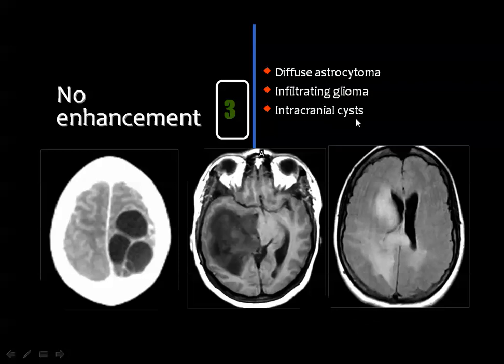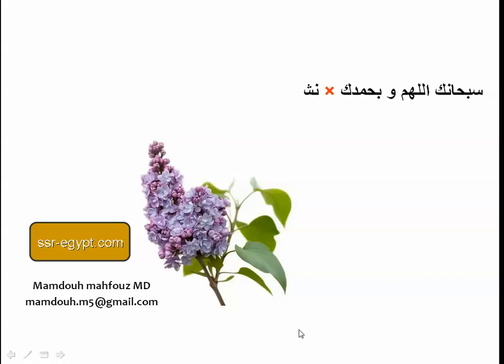Intracranial cysts will be discussed in a separate lecture, and most of these cysts do not show any pattern of contrast enhancement.